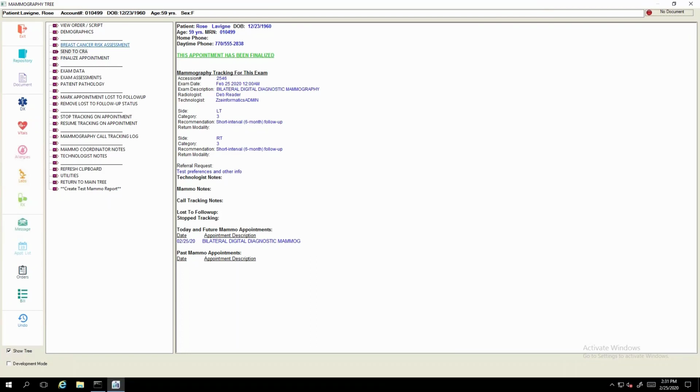What it is doing is, like I said, making those calculations on the different risk assessment models. So it would look for all the information, looking for the Gail risk assessment, the BRCA Pro, and the different Tyrer-Cuzick versions. What it does is, once it does make those calculations, it does save a copy in the document repository into the patient's chart. We do send this information automatically to the chart, so this lives always in the document repository. It always will save a copy for you.